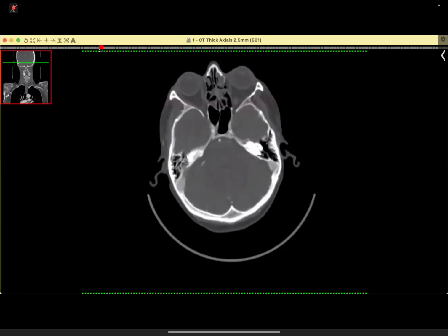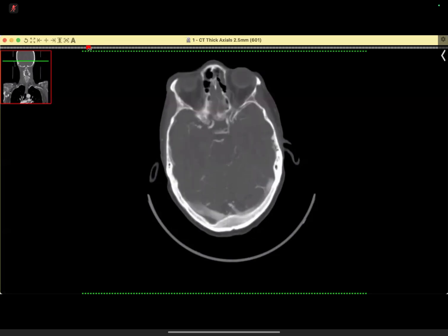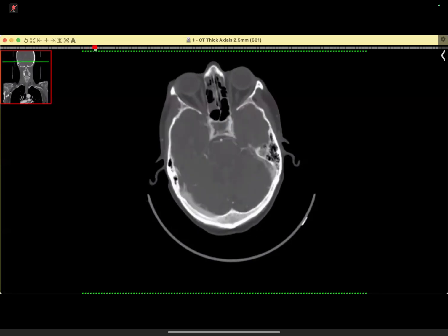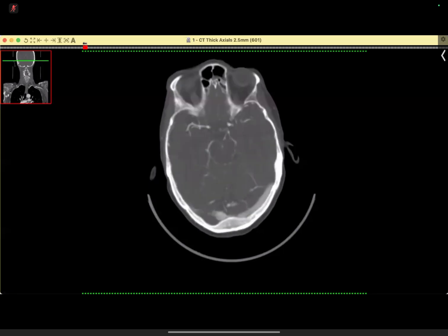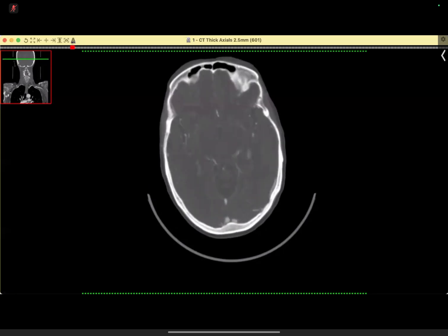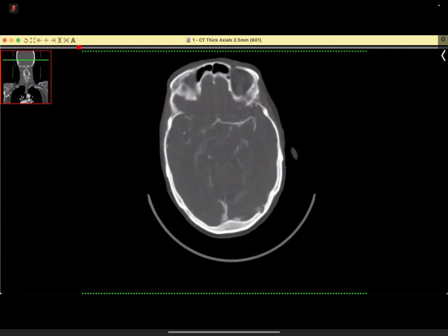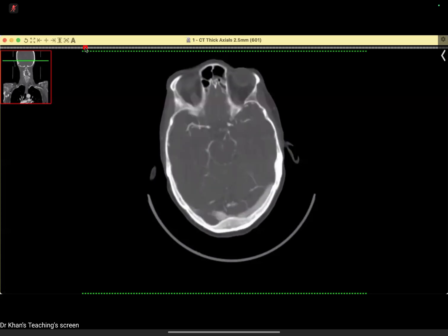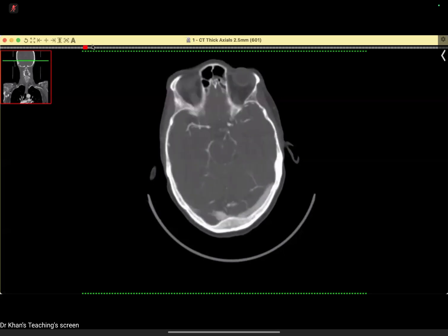I could appreciate a thickening involving the bilateral cavernous and supraclinoid segment. Other than that, I'm looking through the MCA now. So let me tell you that there is no abnormality in the intracranial vessels. So concentrate elsewhere.